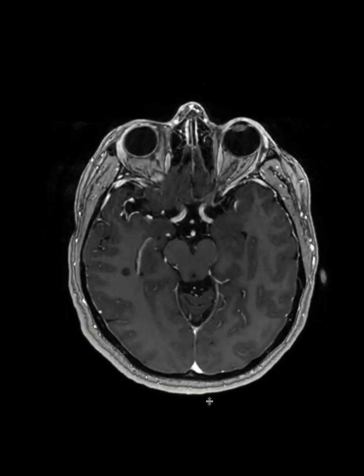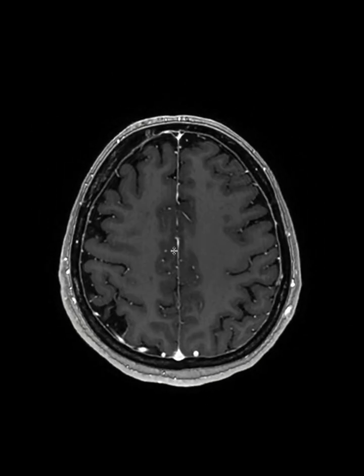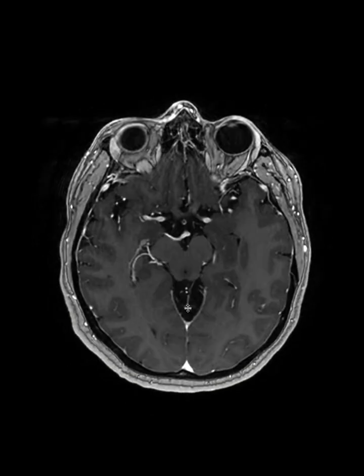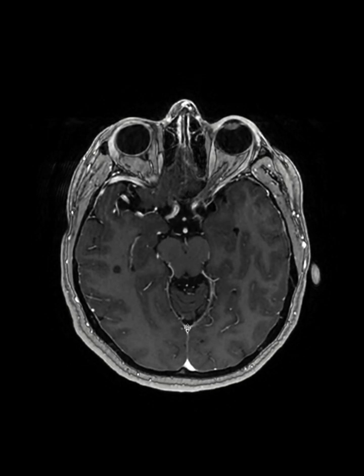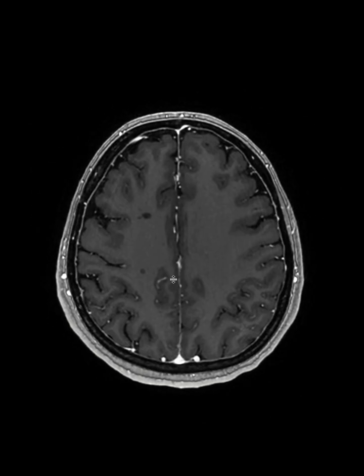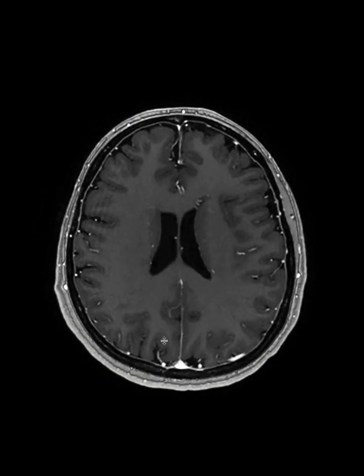This is a post-contrast T1 sequence, and the reason I know is because you see the vessels are all bright. You see the superior sagittal sinus, you see the arterial structures, so this is basically a T1 post-contrast sequence. And usually post-contrast is always done on T1, that's how you know it. Okay, so when you look closely again, you see that these lesions don't have any enhancement.